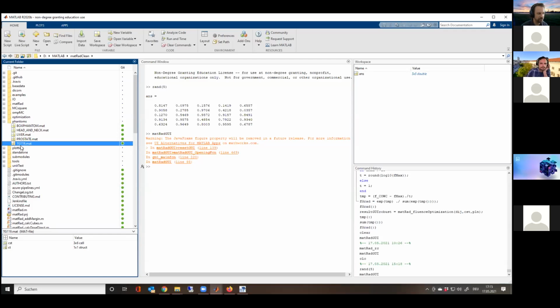And this is not a patient. If you open this and you think it's a patient, that would be a very weird looking patient. That's basically a phantom for use with the AAPM TG119 report on dose optimization problems. So it's a water box that has a measurement hole in it where you can put an ionization chamber, and some structures are delineated on it. So someone puts structures there, and then you can benchmark optimization problems there.